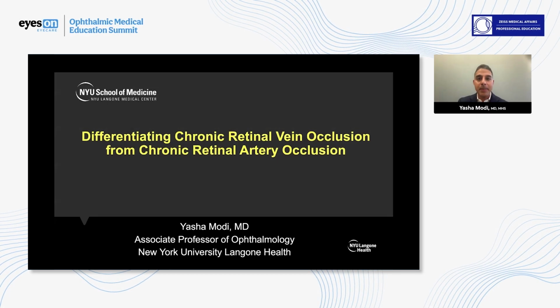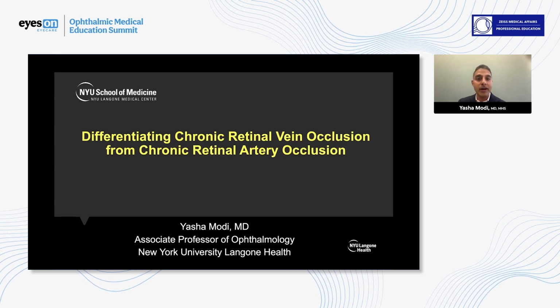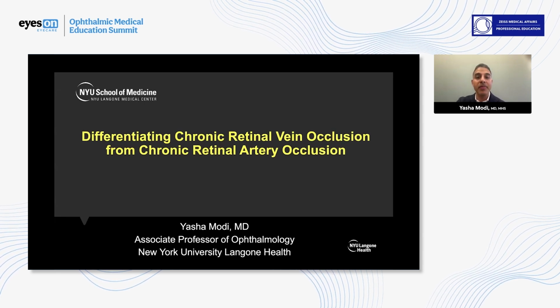One clinical dilemma that I've run into over the years is really differentiating chronic retinal vein occlusion from chronic retinal artery occlusion. And I'd like to demonstrate how OCTA has helped me with this dilemma.